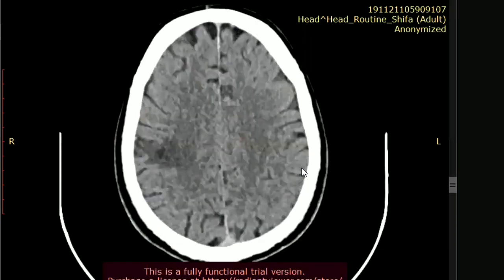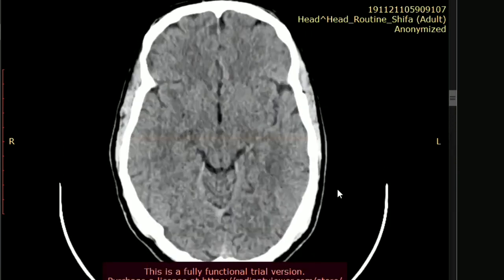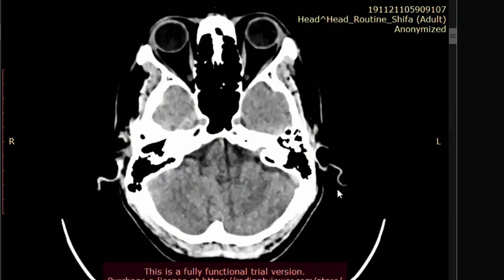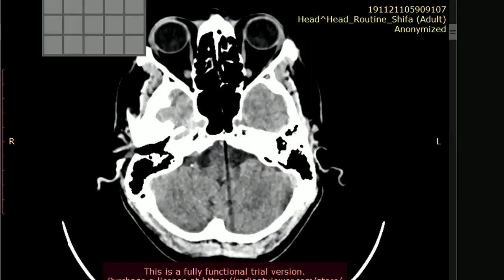Okay. And do you want to confirm it further? Do you want any other images? Ma'am, I would like to go further with the MRI.